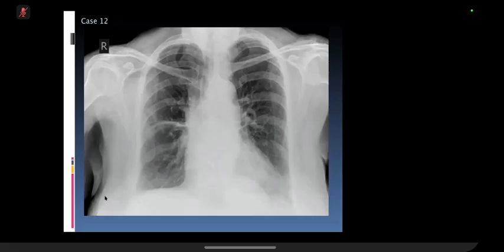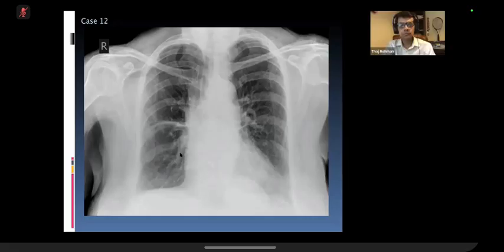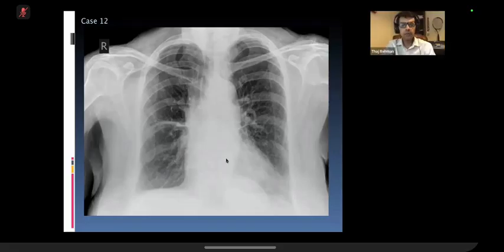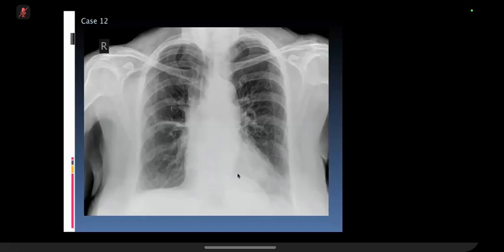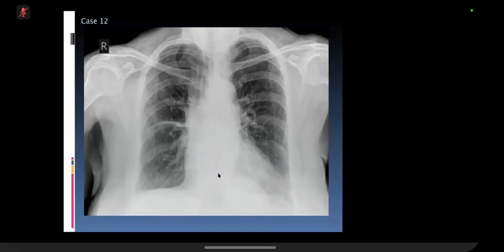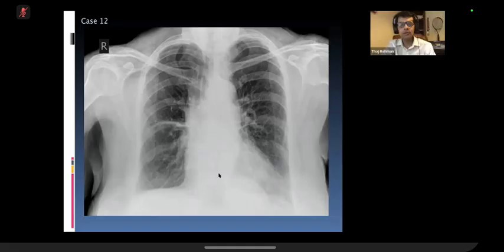So I wonder if this would be the posterior aspect of the lung, or possibly a hernia of some sort, probably a Morgagni hernia. I would say Bochdalek hernia, because Morgagni is anterior, isn't it? Yeah, Bochdalek diaphragmatic hernia. Just keep it as simple and say diaphragmatic hernia, then you have covered both Morgagni and Bochdalek. So basically a defect in the diaphragm through which something from the tummy is going up into the chest, into the posterior mediastinum.